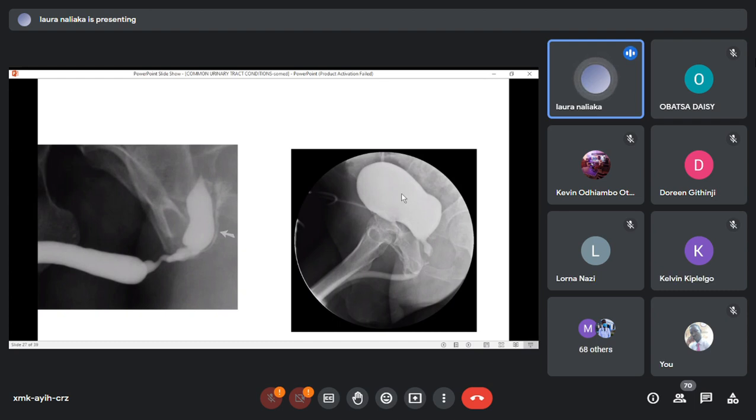Then we asked the patient to try and pass urine, but could not pass because there was a tear or discontinuity of the posterior urethra, and we were able to pick the distance between the distal aspect and the proximal aspect, which was the region of injury, and we were able to measure. It was a very stenotic stricture caused by the injury.